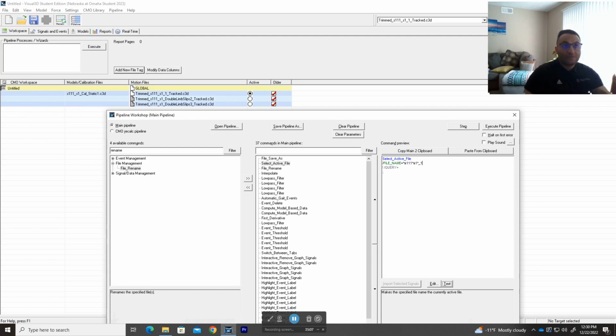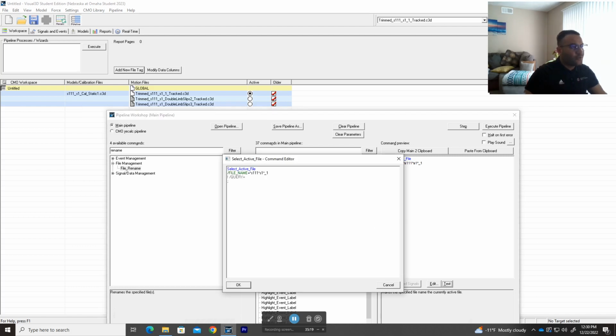And when you have that for loop like I mentioned, you can run a for loop with only certain numbers and then only replace those numbers, so it will save you a lot of time and a lot of headache.